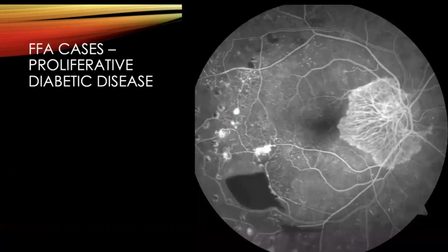So I wanted to just show some typical cases that you might come across. So how do we interpret an FFA? Looking at this first case, what you can see here is a patient's right eye. And what you can immediately say is that this is a fundus fluorescein angiography taken of a patient's right eye centered on the disc and macula. And before you go into it, you want to describe what phase this is in. As we said beforehand, what you can see here is full filling of the arteries, but you've got this laminar flow of the veins. So this is a fundus fluorescein angiography of a patient's right eye centered on the macula and disc, and this is a picture taken in the early venous phase, as shown by your trilaminar flow of the veins.